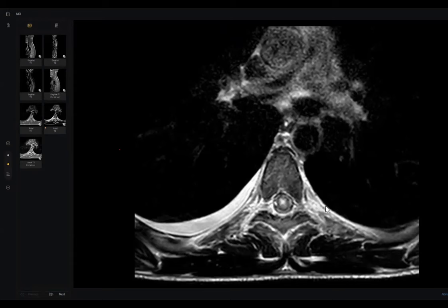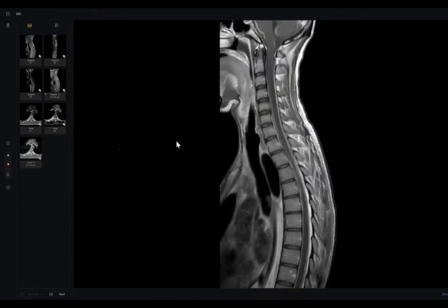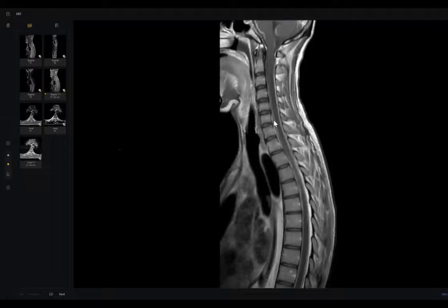Sorry, can tuberculosis affect the spine directly? I'm confused because there is an intramedullary lesion, giving the abnormal long signal. What happened here? Where is the main pathology? Intraparenchymal or meningeal? Meningeal, yes. There is more enhancement. Okay, this is the first point.